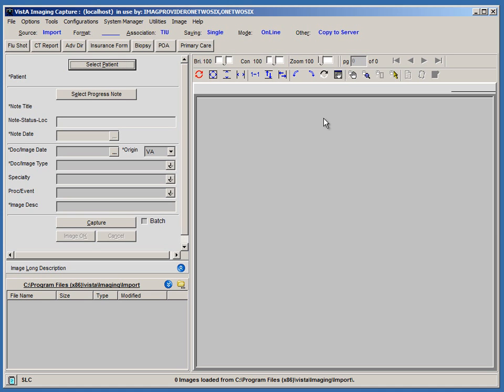It is important to note that at the time this module was created, there are known issues with some of the image manipulation tools not functioning properly with the Patch 140 Clinical Capture application. The Rotate, Invert, Pan Window, Flip Horizontal, and Flip Vertical buttons may not work depending on the document scanner and the settings being used. These issues will be resolved in a future Clinical Capture patch.